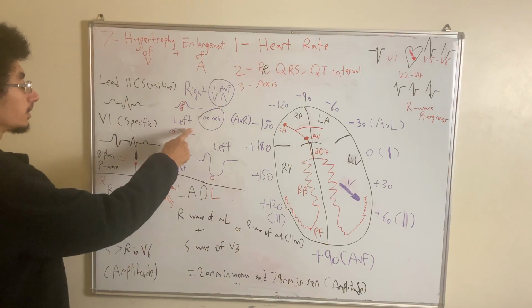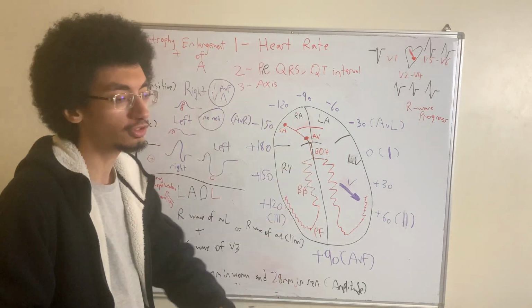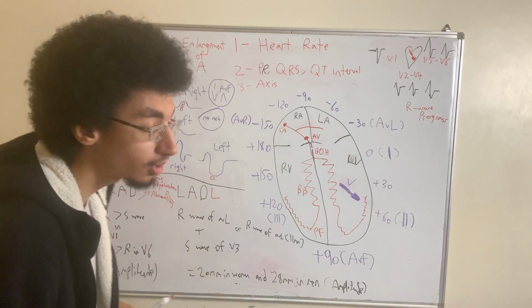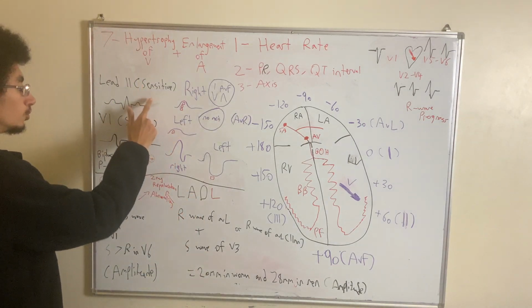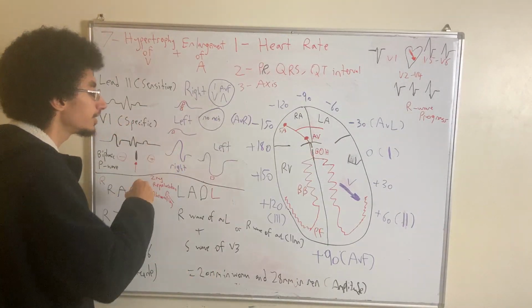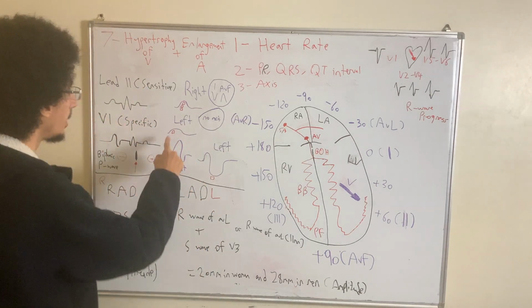First of all, in left atrial enlargement, there's no axis deviation. There's none. Why? Because the left atrium and left ventricle, they're the dominant ones. So you're not going to rely on left axis deviation. There's no axis deviation. It's normal in case of left atrial enlargement. However, when we look at lead 2, compare this one, we can see two things. Number one, the amplitude is increased. More than one small square. So more than 1 millimeter. That is for the amplitude.